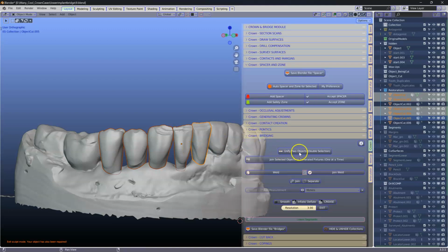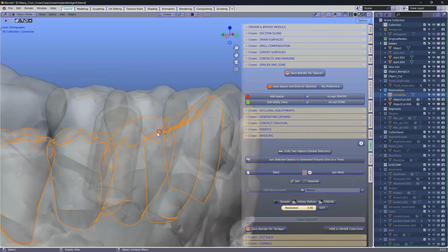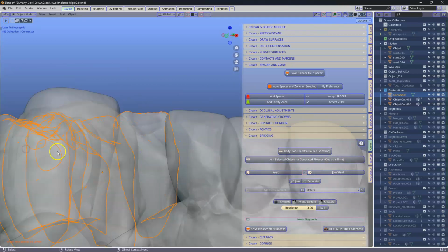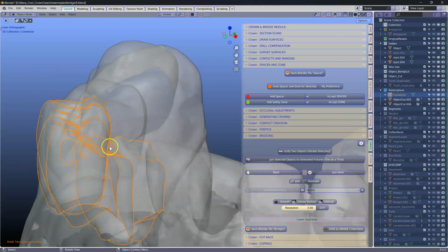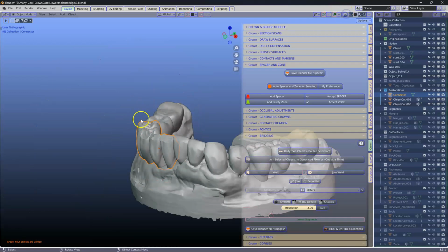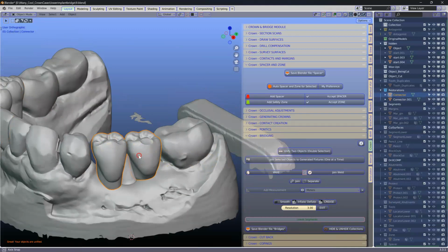And now you're going to use this one over here. Now once you've done that, you should just double check in transparent mode that this is all one object. You can see by the fact that these have like little circles there, like that. So this is all one object, and I'm going to do the same on this one over here. This one there, unify. Great.